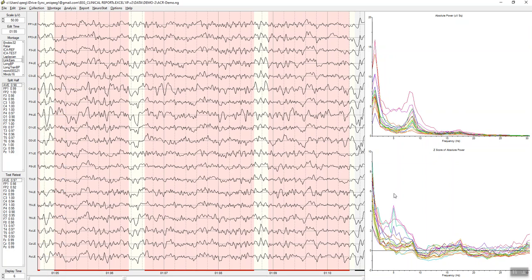and demonstrate that no matter what you select, as long as it's artifact free, the patient has the same linkage. In this case, this individual was assaulted and struck in the right parietal region. He's paralyzed on the left. He has spatial neglect to the left side of the visual field. He doesn't shave the left side of his face. So there are the classical symptoms of right parietal lobe damage, and you can verify that deviation in the parietal lobes at the surface, as well as using the NeuroNavigator.